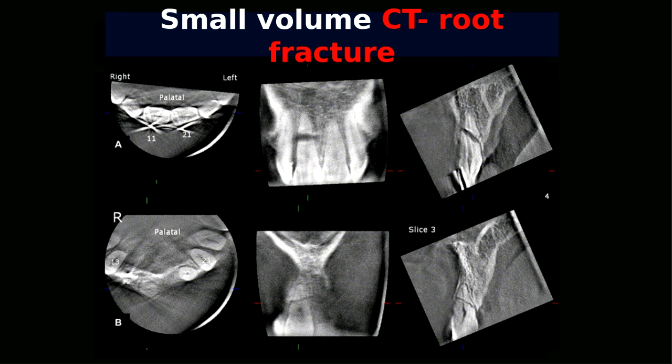If you have a CBCT scan, you can actually tell one by one. Yesterday we had one patient where we have a root fracture on the palatal root. So we actually found out through the CBCT scan, and the fracture goes all the way. This is from the anterior, but that's fine. The oblique fracture shows like this, and based on that, your treatment plan also changes.